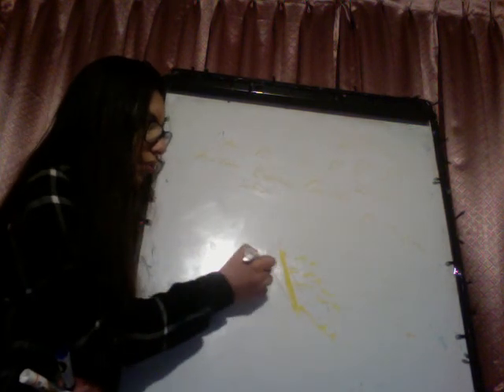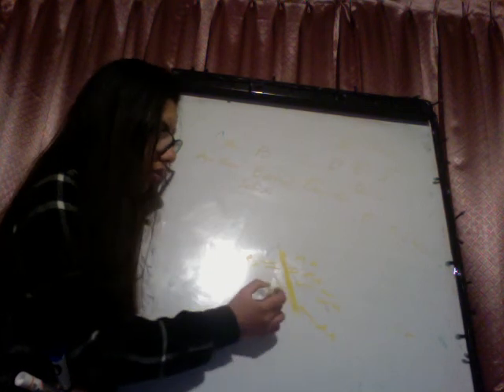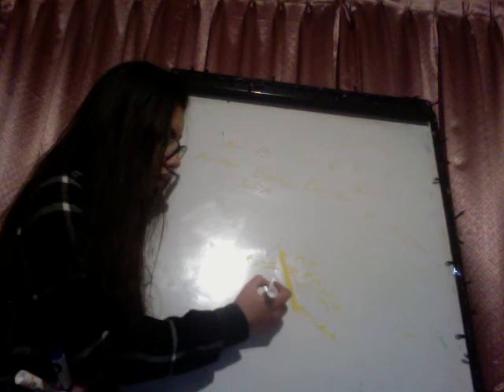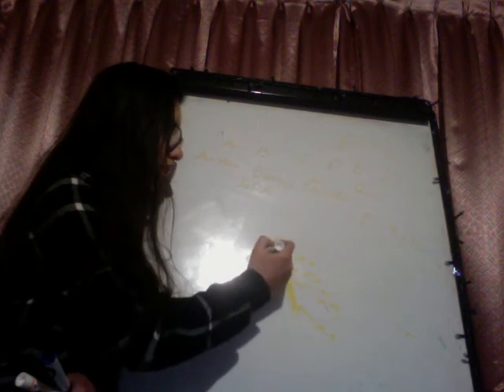Next, in the right, we have in mirror image the right pulmonary artery, the auricle, right atrium. The right atrium would be a little bit below the level of the left one, and maybe we could see here the ascending aorta, how it is ascending like this. We would see the ascending aorta.